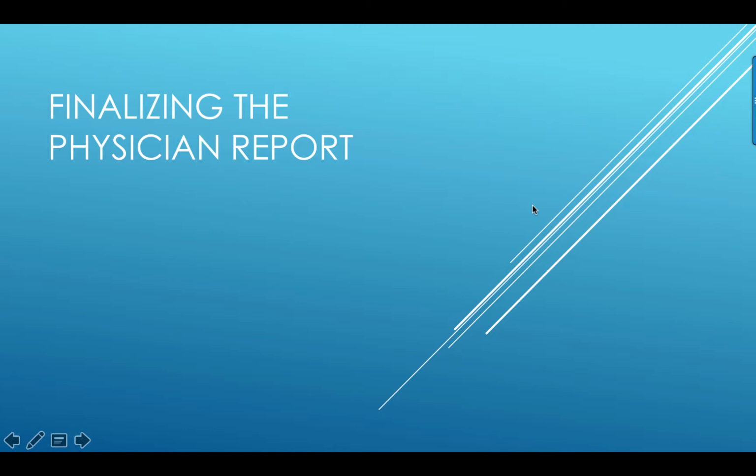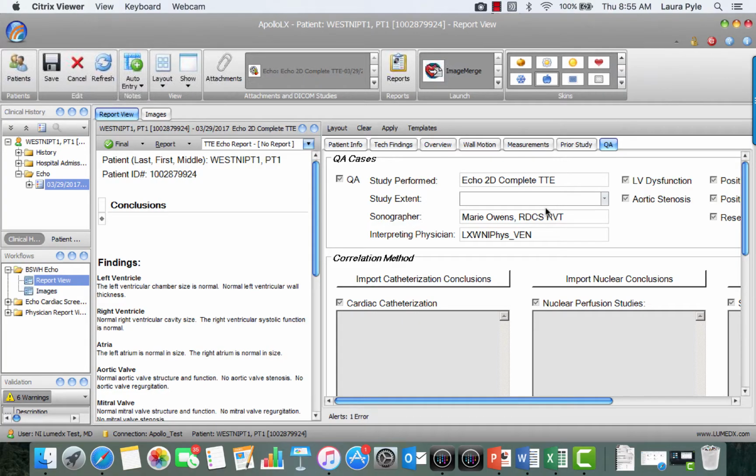Finalizing the physician report. You can preview the physician report by viewing the data in the report view. As you are entering your findings, the data will populate in the preview window. Always change any data on the data entry forms and not in the report view.